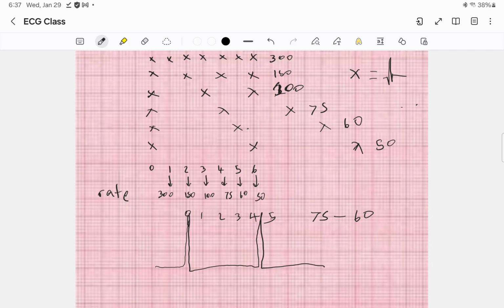It's just an approximation that allows me to rapidly interpret the ECG, especially if that is not the most concerning part of the ECG. So I'm, one, rapidly able to determine if it's normal or abnormal, and two, give an approximation without doing a whole lot of calculation, for example, with the small box method. I would say over time, counting the rhythm strip becomes really fast as well, except for when the heart rate is really rapid.